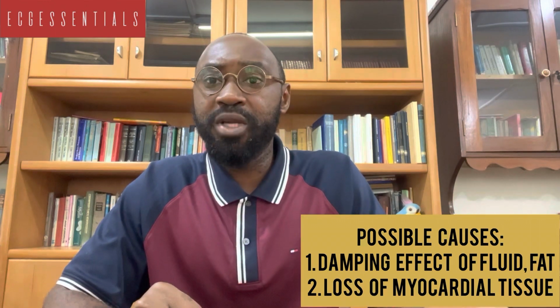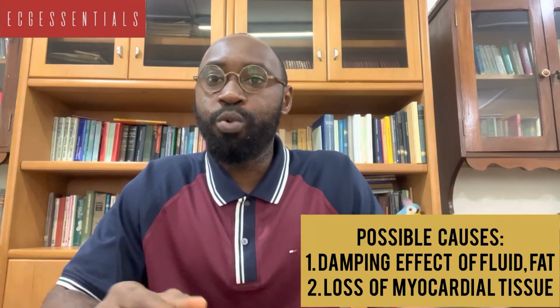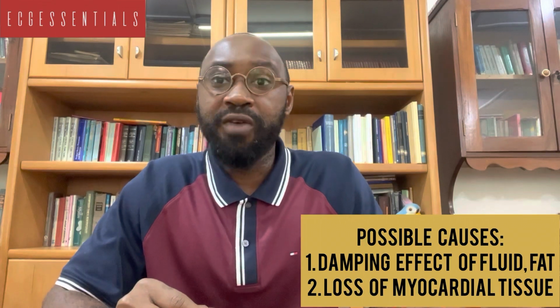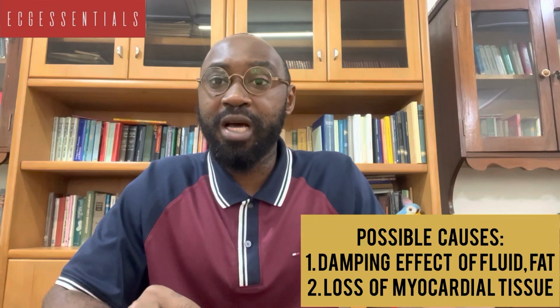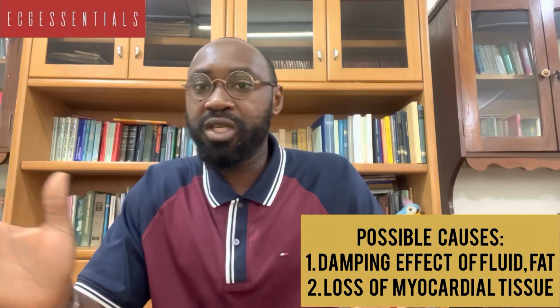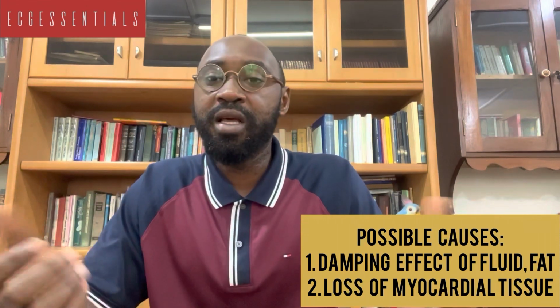That may also be the case in obesity, where fat will be the source of that damping effect, and in emphysema and pneumothorax, where air will be the culprit in creating that damping effect. The other thing we mentioned was loss of myocardial tissue. So, for example, the MI and then the last stages of DCM that we have talked about.